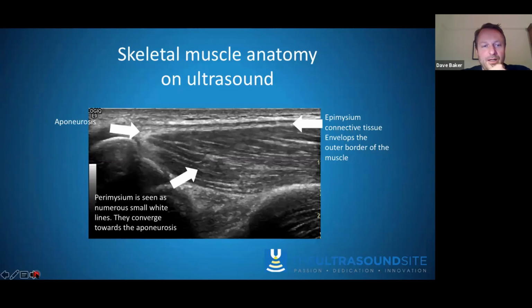It allows us very nicely to identify also the direction of the pull of that particular segment of the muscle. So where we've got bipinnate muscles or complex muscles, oftentimes we get angulations and diagonal patterning of the perimysium of the muscle. If we've got a simple muscle, then oftentimes the perimysium are laying just in a straight longitudinal plane. We go on to the next slide, please, Stu.